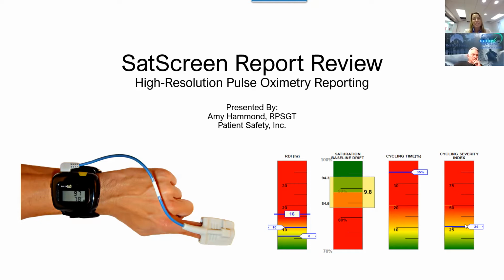Today, we're going to be doing an in-depth dive into the SatScreen reports. Primarily, the goal today is to go through different cases and form a systematic way of reviewing your reports and bring together what this information may help you do, or what actionable items there are based on the information in the SatScreen report. So we'll go ahead and get started.